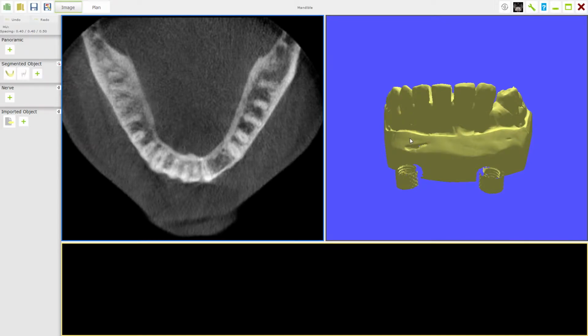This is far superior in terms of capturing the gingiva, the recession, the restorations in the mouth, all the kind of things that you really can't see on a model, but which you can see from photographs and from an intraoral scanner. But of course, intraoral scanners are quite expensive at the moment and require some investment. So many of you may prefer to take an impression and send it to your laboratory to make a model and then scan it. The beauty of this is that storage is no longer an issue when it comes to study models.